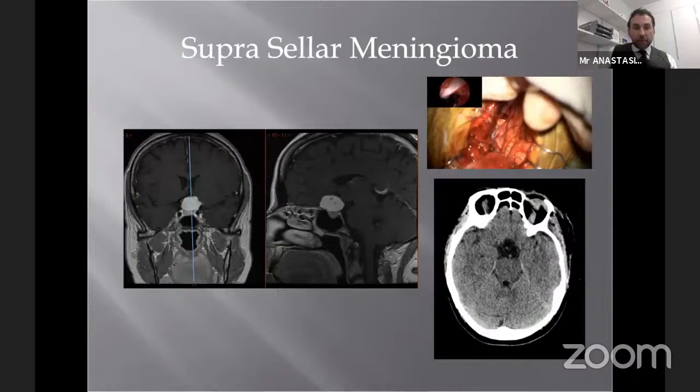That's a suprasellar meningioma. It's difficult really to say if it is tuberculum sellae or planum sphenoidale, but it doesn't really make much of a difference. We can name them suprasellar meningiomata. They present usually in middle-aged females. They can cause rapid visual deterioration, as this patient suffered.